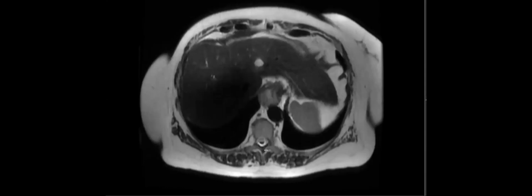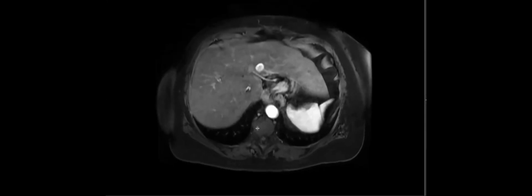Okay. And let me show you the T2 again. That's the T2. An atypical hemangioma, but I don't feel like you can call it that. We have seen cholangios that have been really T2 bright and really avidly enhancing, actually. I think you still have to call it an LRM. Good. Okay, the patient got a biopsy and it was benign. But they saw something else on ultrasound.